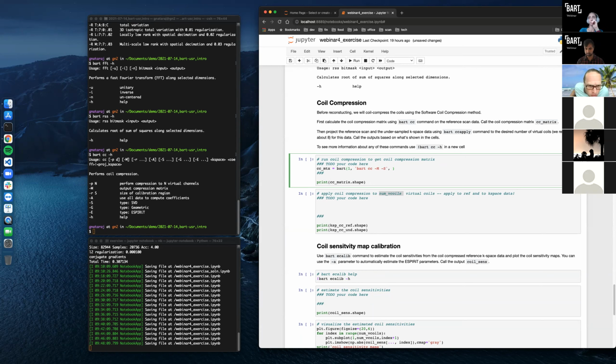So we're going to be working on the image data, right? We actually compute the coil compression matrix directly from K-space. Actually, that's an interesting question, if you can compress it, use the image data as well. I don't know that, but okay, so K-space.